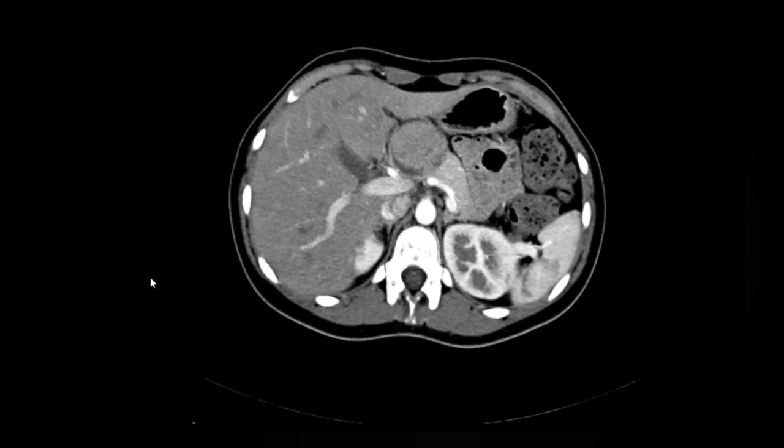No. Yes, sir. No, it is not cystic. So this is solid. Sir, it is cystic, yes sir, it has some solid component in it. Sir, if you don't give the history of pancreatitis or any fever, debilitating condition, it may be walled-off necrosis, but as I'm not seeing peripancreatic fat strandings, my first diagnosis will be pancreatic CA, sir.